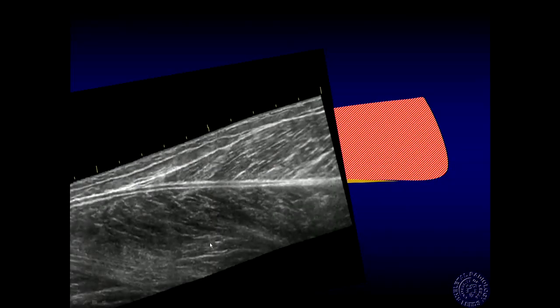Anterior to that, you've got the soleus myoaponeurotic fibers. And this is where understanding your muscle anatomy and functional anatomy is really important, because these muscles have different actions in the calf, slightly different actions, not completely different. The gastrocnemius inserts above the knee on the posterior aspect of the femur and extends down to insert on the calcaneus below the ankle joint.